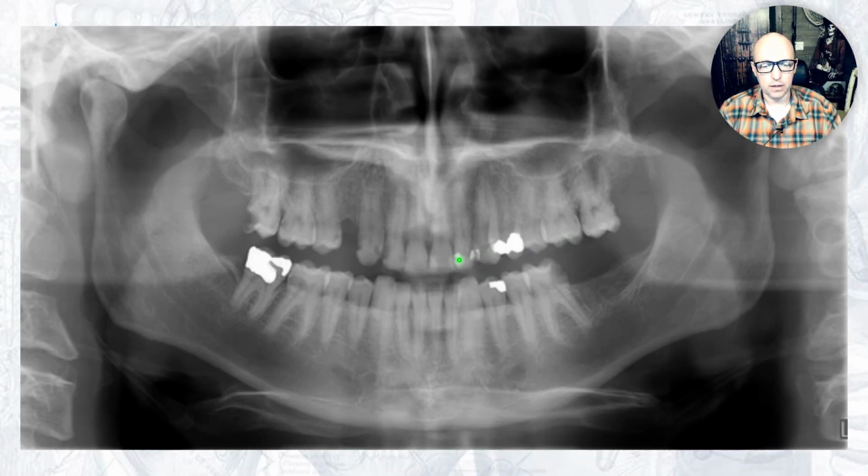Maybe you'd argue there's a little bit of a Joker smile. Chin was down a little bit. But I would rather that than the other way around, as I was saying. Look at the hard palate line. With the chin down a little bit, the hard palate line gets projected even further away from those roots of the molars. So I would say this is good to acceptable, if you want to get really nitpicky about not being too much of a smile line, too chin down.